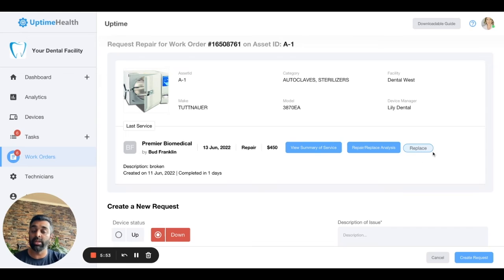And we'll even give you our recommendation. Remember how we said it was replaced? This might be a moment that we look internally and say, maybe we don't get this repaired. We just ask for a quote for a new product instead, because of the data, maybe it's the failure rate, the age of the equipment, it's already depreciated, its expected cost of ownership in the next year. All these data points we take into consideration when giving you this recommendation.